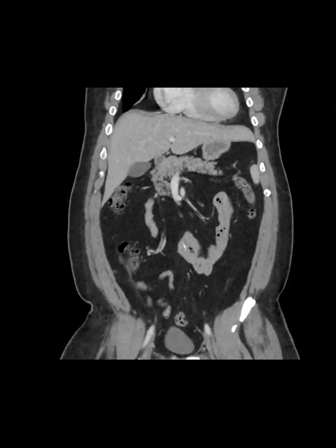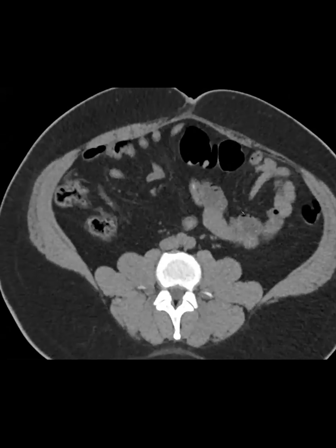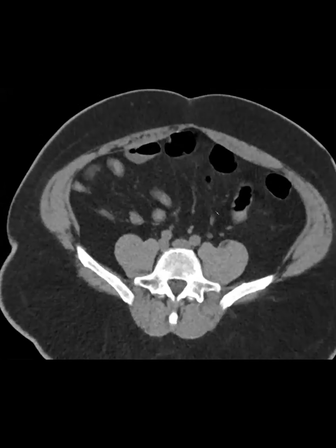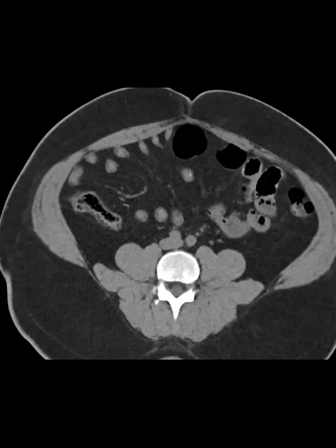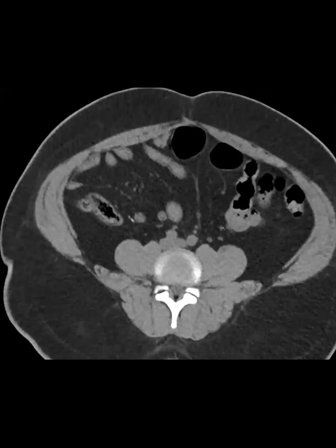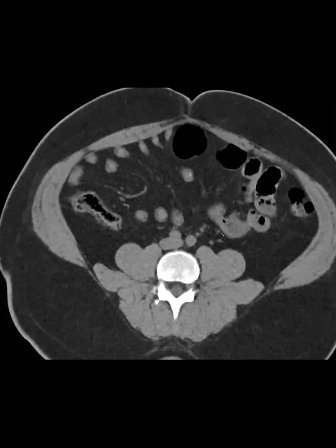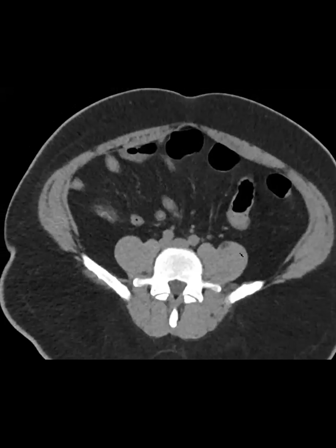And actually we did another scan 2 days later. And so you can see that where the fishbone was before, it is not there, but it has progressed further here. So now it's in the mid-jejunum. Even though they did a small bowel push enteroscopy, they could not find the fishbone. The patient was doing okay. The melena had stopped, and so they sent them home. Most of these fishbones will pass, so you don't necessarily need to go and laparoscopically remove it. But yeah, it can cause a lot of issues.